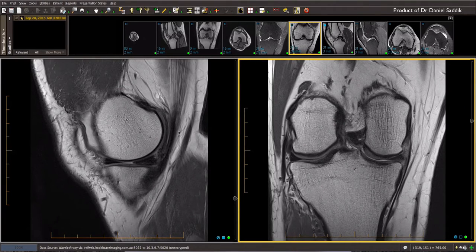And that's why I say to the techs as well, whenever a patient is moving and you can only get one sequence from the patient, always do a sagittal PD. You'll note that most people's sequences run as PD and PD FATSAT. We call them T2 FATSAT, but strictly speaking, they're a PD and PD FATSAT in multiplanar sequences acquired.